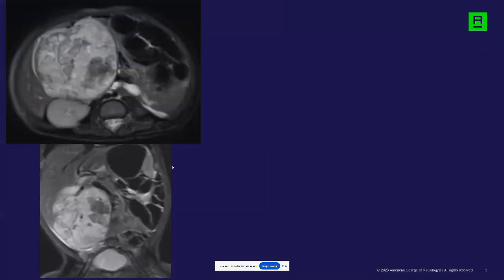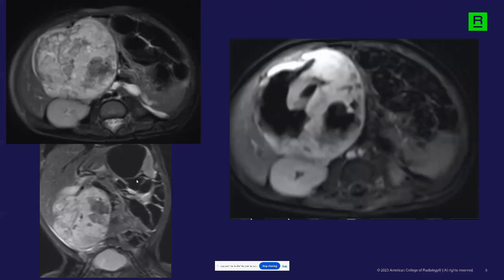This patient also went on to have an MR. Here it is on T2 weighted imaging, similar heterogeneous mass, similar to what we would see on CT. And then here is a post contrast. They didn't get multi-phase imaging on this study, so we've got a single. This is a subtracted image showing that enhancement with the areas of necrosis within the mass centrally.